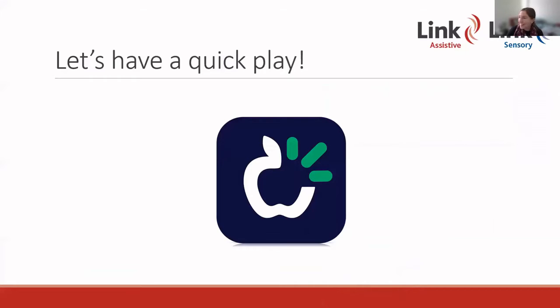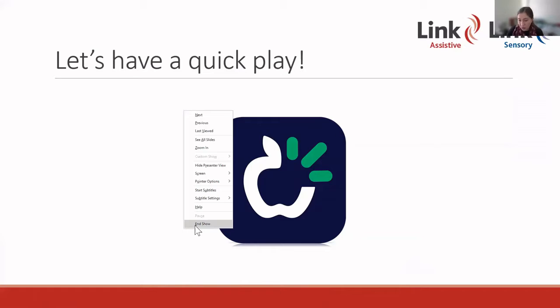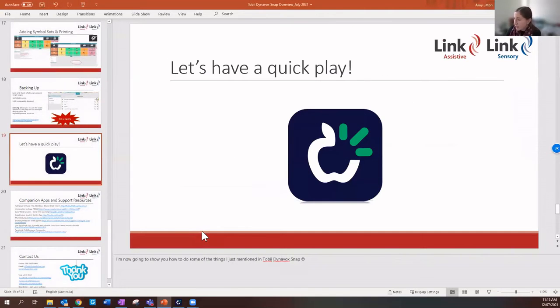Here we go. All right, let's have a play. I'll jump on to the program and I'll just run through some of those features that I just talked about.